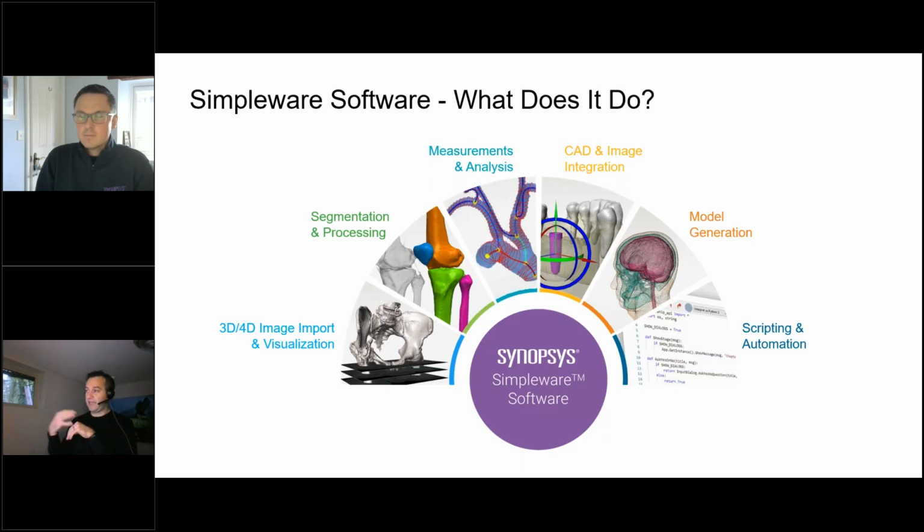You can also import CAD geometry. So if you want to import a medical device, position it, and clean up STLs, you can do that. Then you generate your model, whether that's a surface STL, 3MF, or a NURBS parametric surface, or a full volumetric finite element mesh ready to go in tools like ANSYS, Abaqus, and COMSOL. So we have different applications, different types of multi-physics, mechanical, fluid, electromagnetic, or combinations, for people using us in the simulation space.